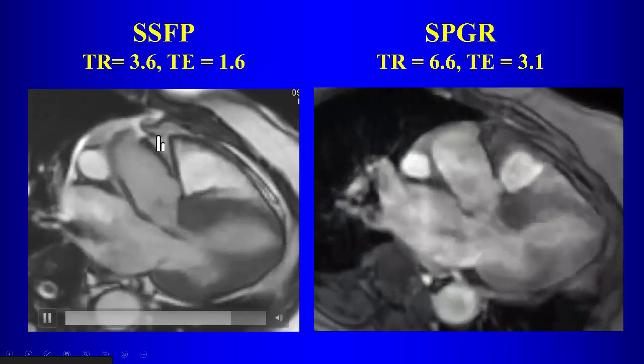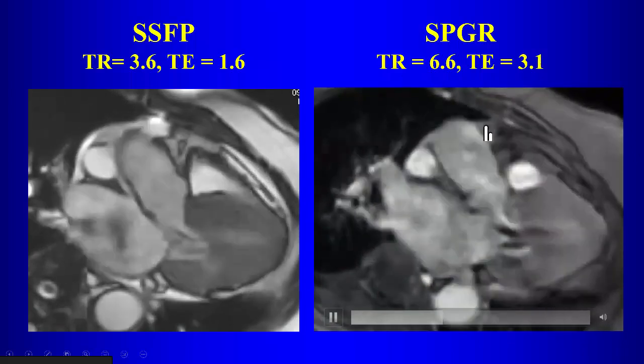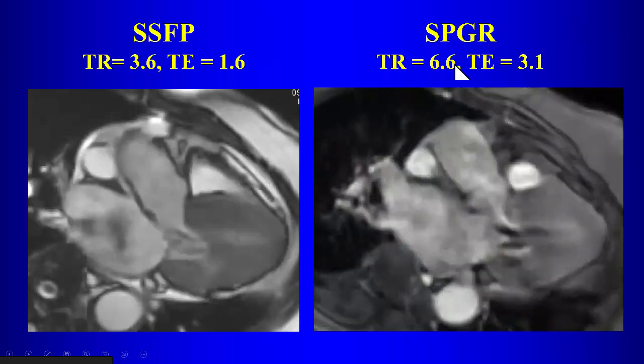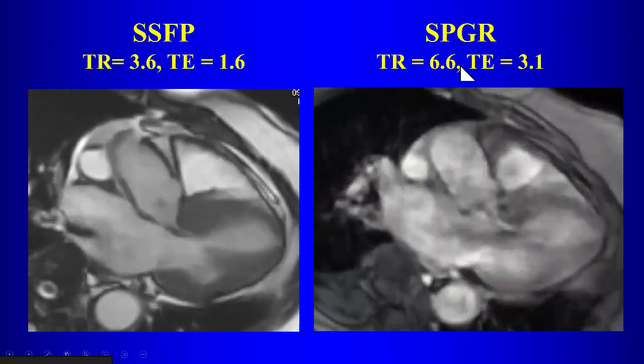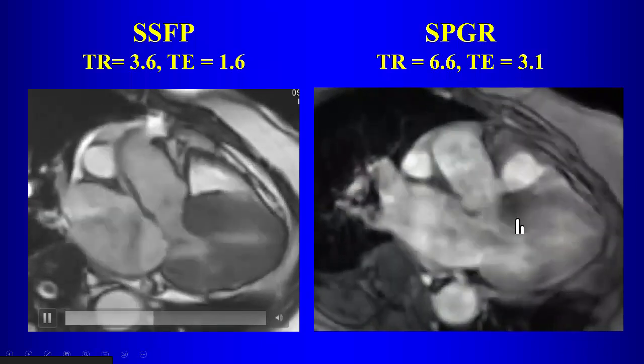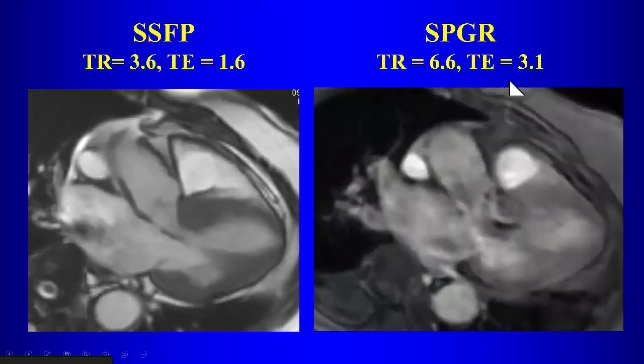Now, having said that, in clinical practice it's usually not an issue, although occasionally it might come up. So just remember that you can switch to this sequence if you're trying to figure out, I think there's some turbulent flow here. Can we see it better? Well, then you might move to this sequence. Okay.